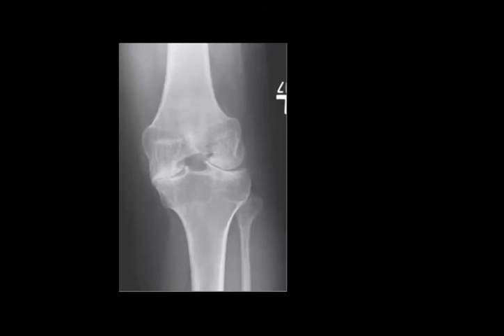Bulbous epiphysis with deep intercondylar notch, wide intercondylar notch. Perfect. So wide intercondylar notch. So you will ask about history of hemophilia and bleeding diathesis, and surely the patient will come to you at a young age, so hemophilia and juvenile rheumatoid arthritis. So enlarged epiphysis and widened intercondylar notch, this is the main clue for you, right?